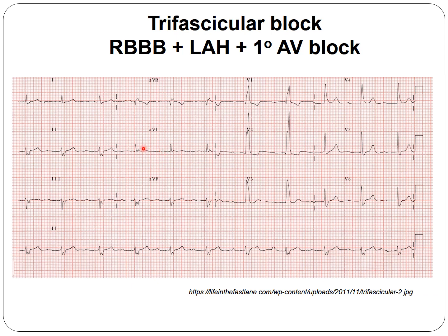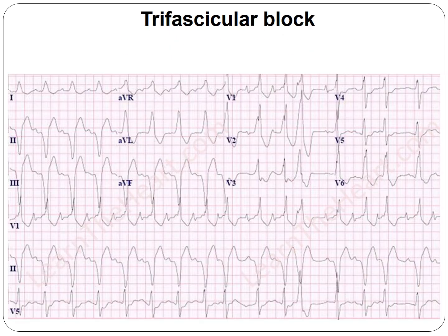In this picture, we can see the typical sign of right bundle branch block. The axis is pathologically deviated to the left, so left anterior hemiblock, and if you look at the PR interval, it's elongated very well. So this is why it's a trifascicular block. In the next, we see the left bundle branch block picture together with increased AV conduction time. So that's a trifascicular block.